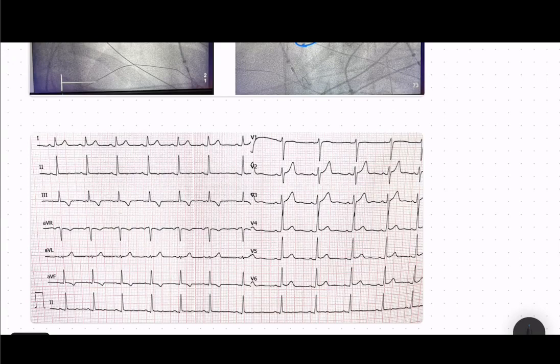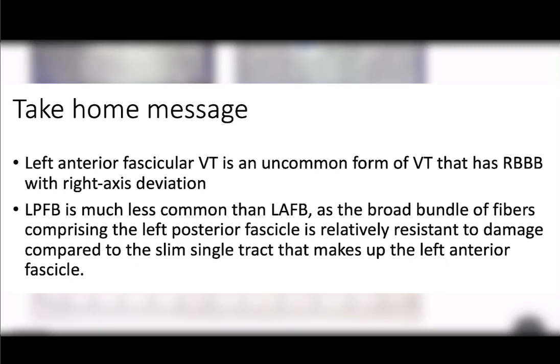Here you can see the ECG after elimination of the delta wave. There is no delta wave anywhere, and there are some repolarization abnormalities after pre-excitation ablation. So the final diagnosis for the patient is orthodromic AVRT with aberrancy.